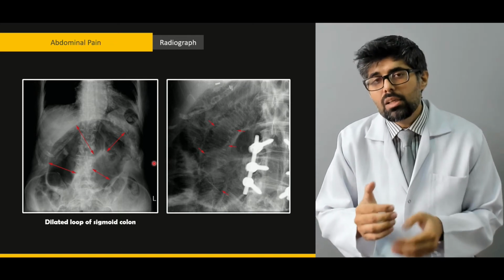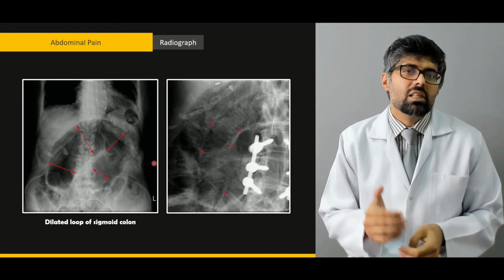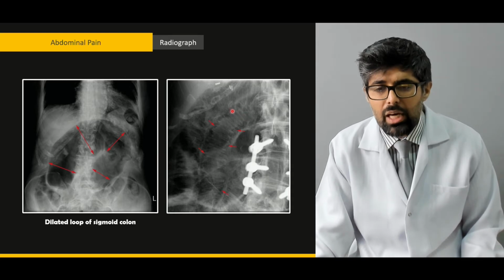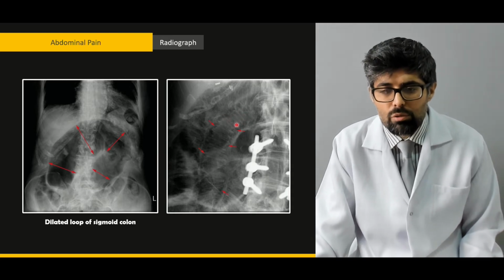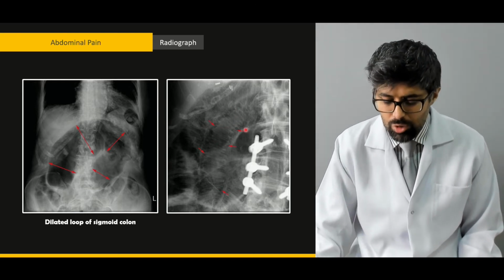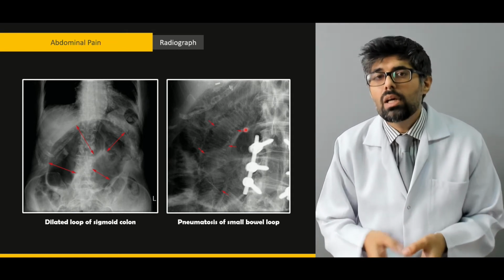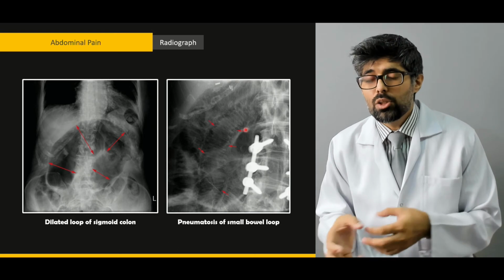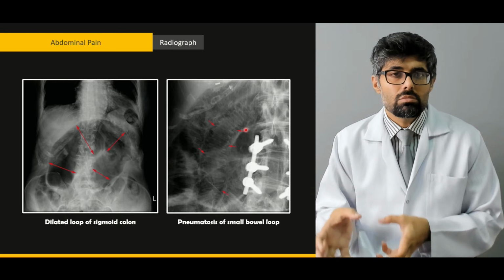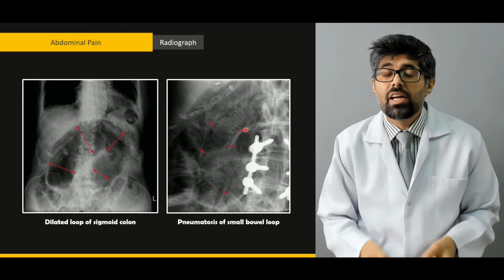Whenever air escapes between the layers of the intestine, it gives us a very specific picture where multiple lines of air and mucosal folds are stacked upon each other. This is called pneumatosis, and it is very common in certain diseases where erosion of the normal bowel lumen makes the escape of air between the layers very easy.